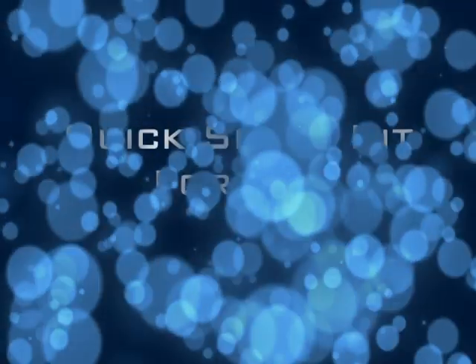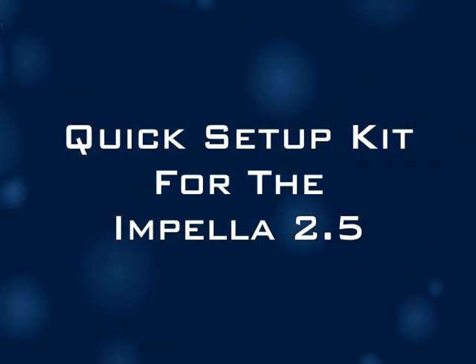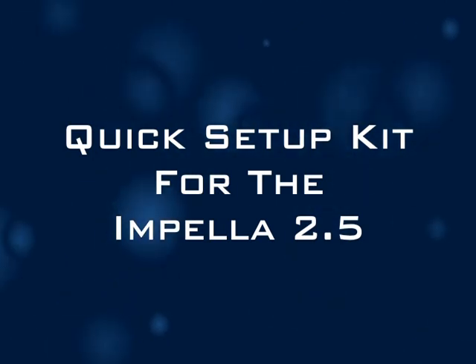This portion of the video is designed to demonstrate the quick setup of the Impella 2.5 catheter and the setup of the Impella 2.5 circulatory support system. This does not replace the instructions for use manual. First, the components of the Impella Quick Setup System.